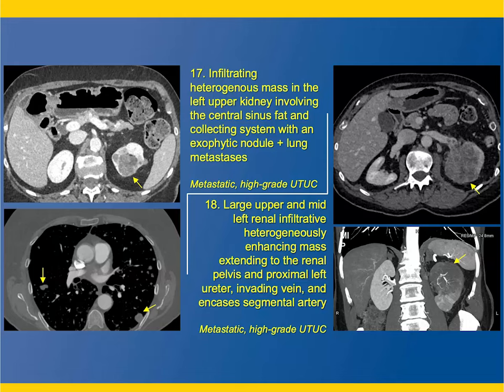You can see on your left an infiltrating tumor, and the patient had lung metastasis, and the imaging on your right, a similar case, infiltration, calyceal deformity, an aggressive transitional cell carcinoma. So I've now gone through a number of cases with you, actually more than 18 examples, from calyceal abnormalities to amputation, from infiltration to bulky tumors.